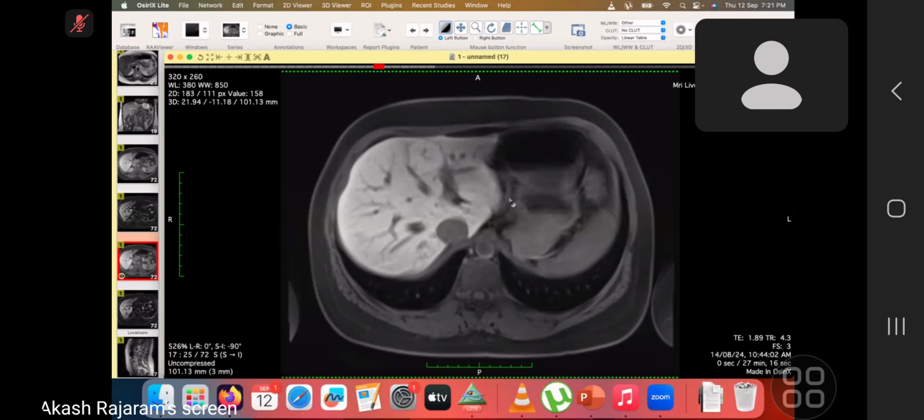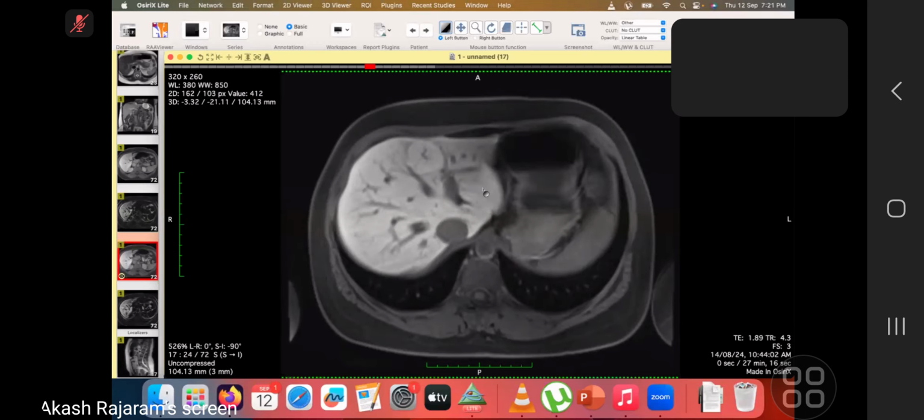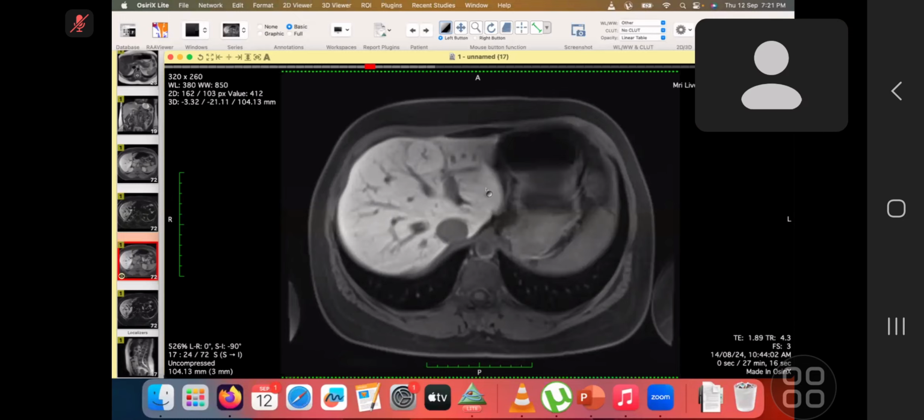So I think that this is a benign lesion, doctor. So focal nodular hyperplasia will have more like a proliferation of normal tissue. So I don't think this appears malignant. Okay, what would you do now? Suggests follow up with ultrasound will be helpful. Yeah. I don't think this is invasive at this point of time.